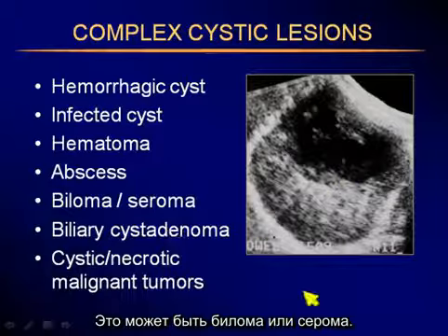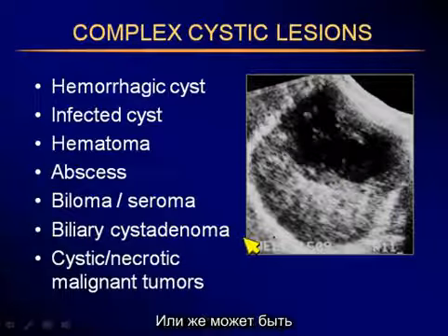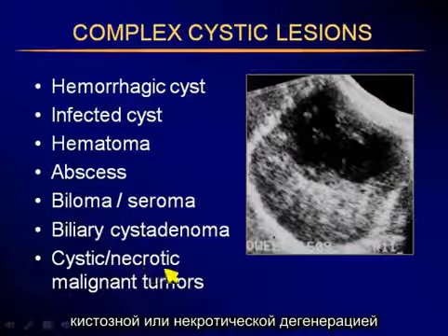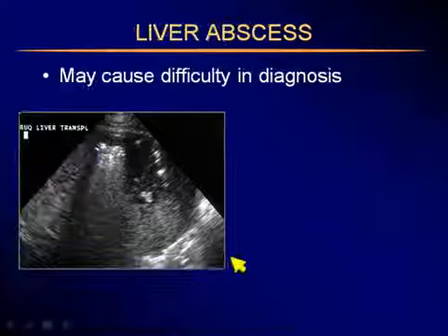It could be a biloma or seroma. Could even be a large biliary cystadenoma. Or could be cystic or necrotic degeneration within a metastasis or a malignant tumor.